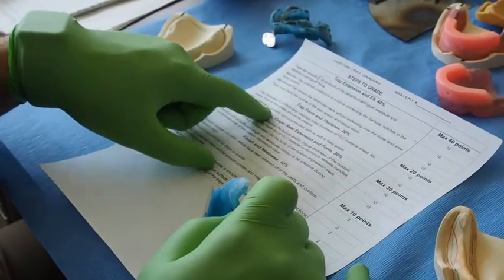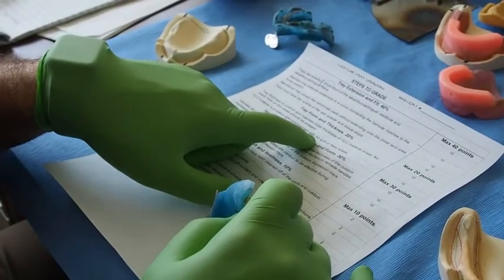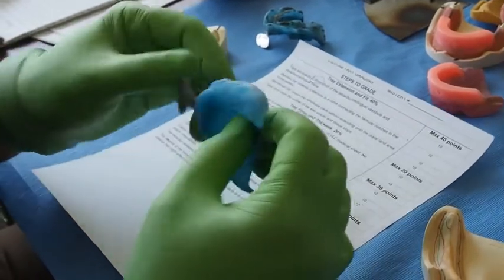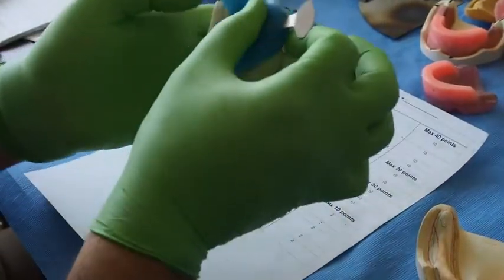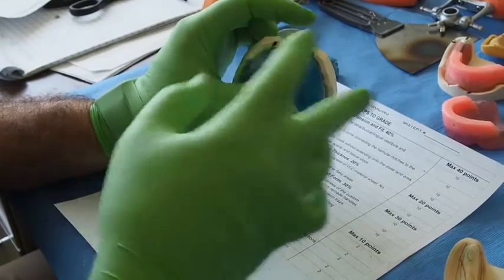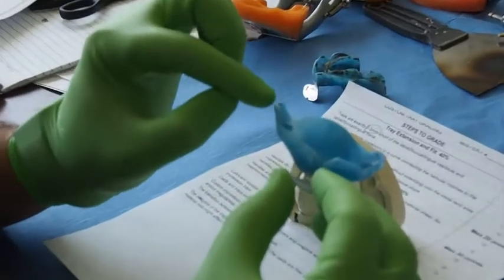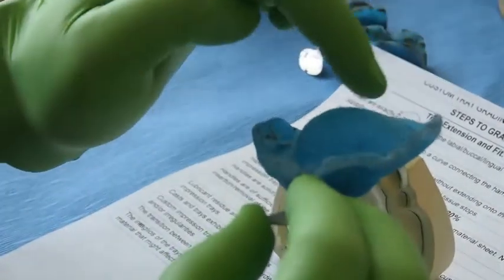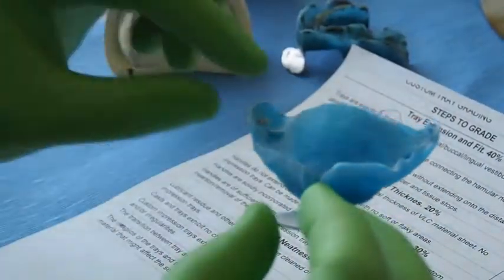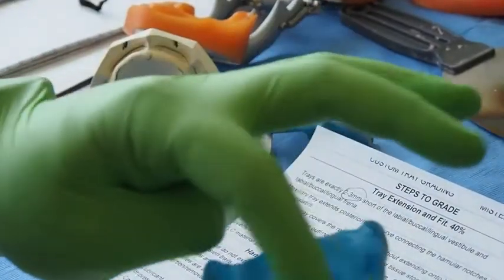The VLC material is properly light polymerized, with no flaky areas. Remember, when you finish and put it into the polymerization or Triad unit, you need to take it off. Make sure the periphery of these areas is completely cured. If not, you might go ahead and put it back in there, just without this, so you can get all the periphery nice and cured.